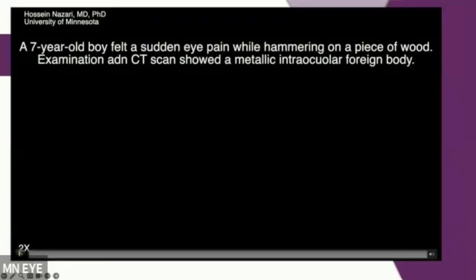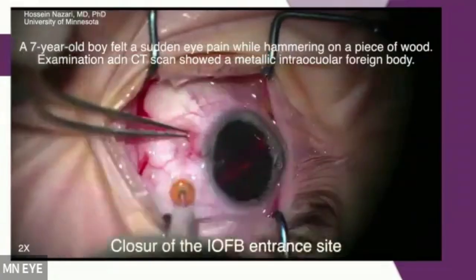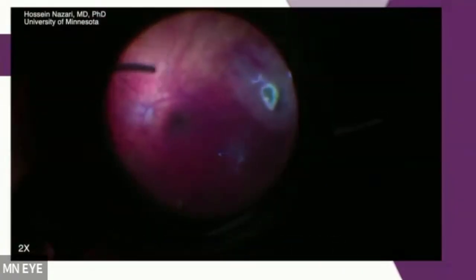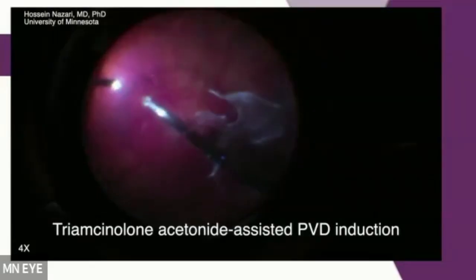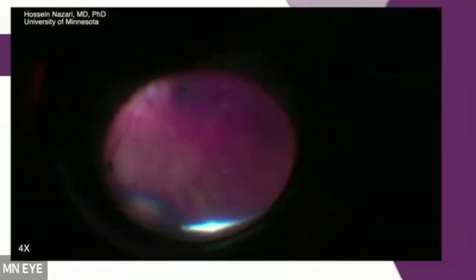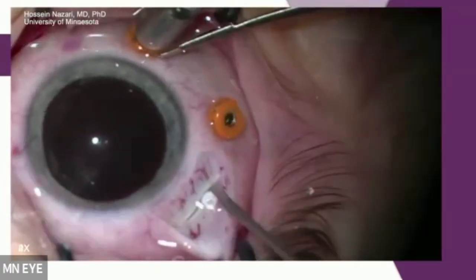Now that we are on the topic of trauma in little kids, look at this 7-year-old boy who was playing and suddenly felt a sharp pain in the eye, and he has a foreign body in the eye. So again, a peripheral foreign body. The front part of the eye looked really benign and good. I see that foreign body in the periphery. Of course, the CT scan also showed it.